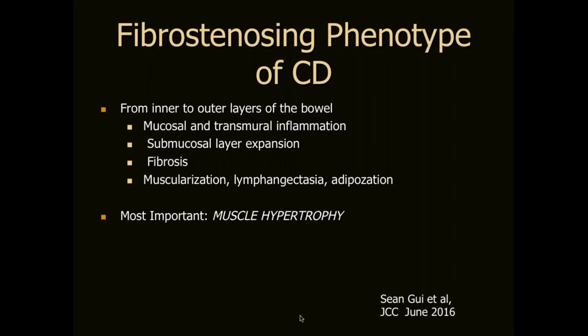And another very important thought that comes from these results is that although we use wall thickness as the most reliable grayscale indicator of activity of disease, there's a cohort of patients who have very thick bowel, such as I've just shown you. This thick bowel measures, in fact, over 1 centimeter in thickness, and yet it does not reflect activity. It reflects chronic hypertrophy of the muscle, causing this marked increase in the caliber of the bowel.